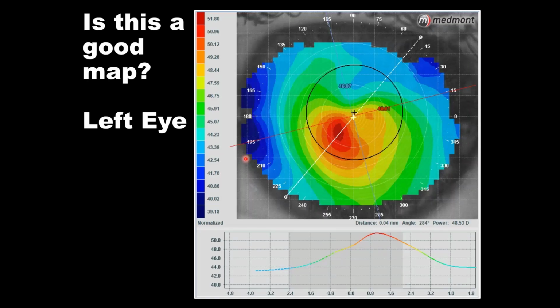Here we have another keratoconic patient. Steepest here, flattest here, separated by maybe 4 millimeters. Now, is it possible that this is topographical error? Could this little divot or flat spot in the eye that's within a millimeter of the steepest spot be an indication that we have some kind of topographical error due to corneal staining, corneal scarring, poor tear film?